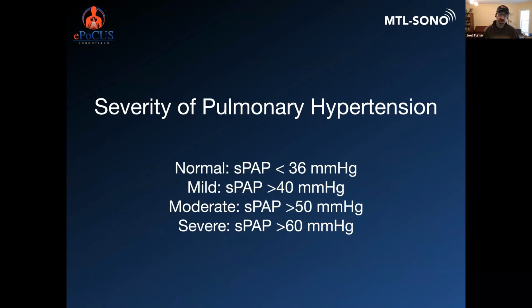And so we have to see what our situation is. Does this patient have a normal echo from a few months ago, in which case something has happened to that RV to maybe suggest a cause of this patient's symptoms who presented? Or is this somebody with known pulmonary hypertension and this is a stable chronic pulmonary hypertension? So this is a lot of information that you can get over and above what you see in the left ventricle.